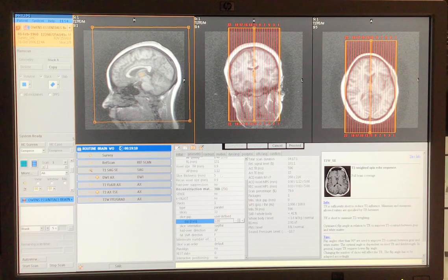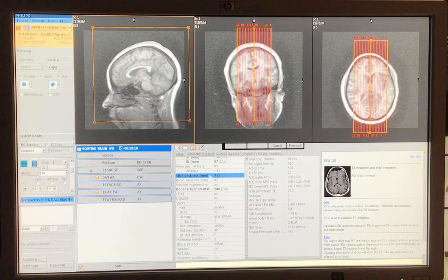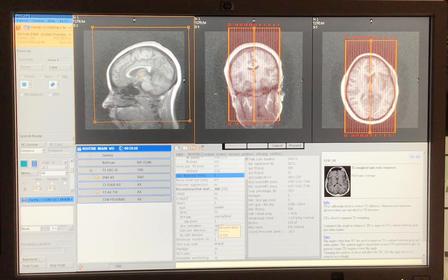But I want you to always be looking for this, because I can save it and I can change it to 3 if I wanted to. And then when you pull this up, you're going to say, well, it should have been 5. It was 5 last time. You really do want to be looking at these to make sure that it is at 5 at 1. Okay? And I'm even telling you that's on the geometry page.